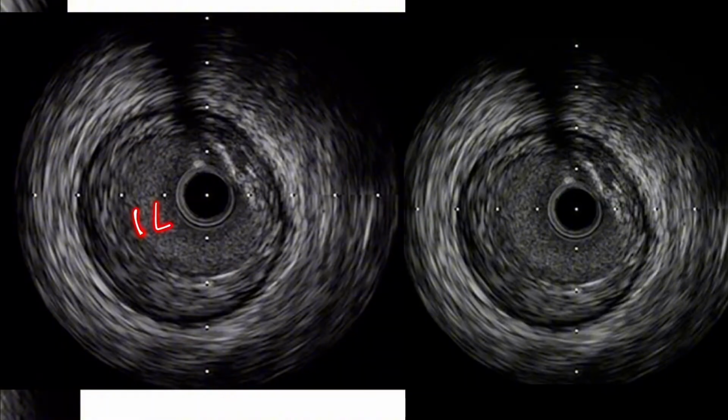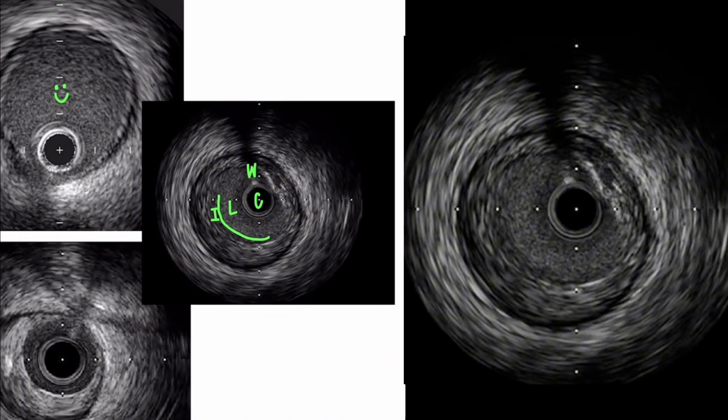What's the next vessel layer? The intima. And then where is the media? So I'm going to write this in there so it stays. This is the catheter, wire, lumen. Intima starts kind of here. And then where's the media? We said the media is a darker black band. So zoom out with your eyes a little bit here. Do you see a black band you can trace your fingers around? Should be about right here. Okay, so that is the media, and then where it changes to white over here, that's the adventitia.